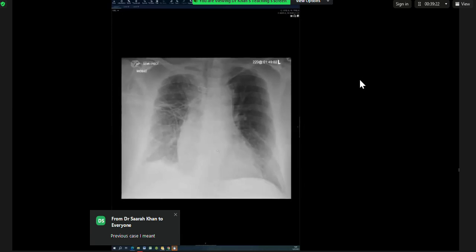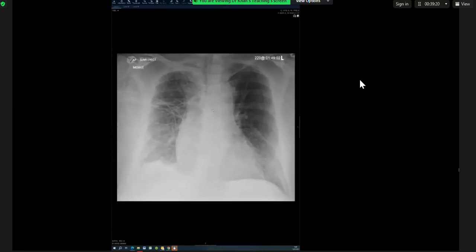When you start with the chest X-ray, take a few seconds, pause about 5-10 seconds to take in all of it, and then have a little paragraph ready before you start. This one you see straight away is a typical heart failure chest X-ray. When you describe it, start from the lungs, start from the most obvious abnormality, and don't start with the pneumothorax, pneumomediastinum bit, because that may be a thing you do in rapids maybe, but not in a VIVA description.